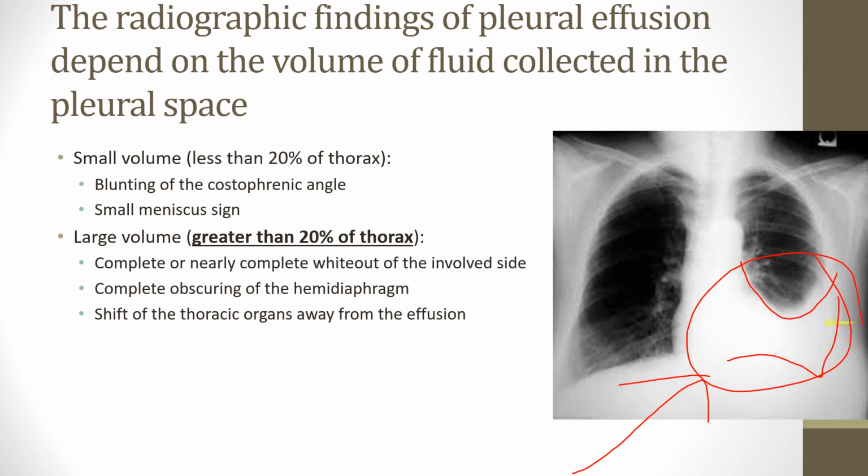So would you treat this one? In theory, yes, right? This may shift the thoracic organs away. So in other words, the heart and mediastinum would be shifted towards the right side if this is on that patient's left side.